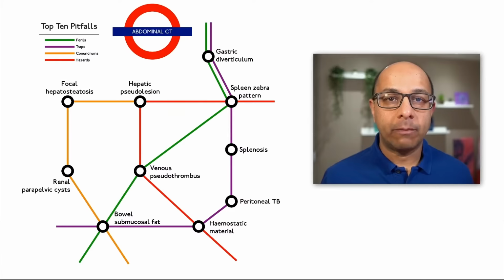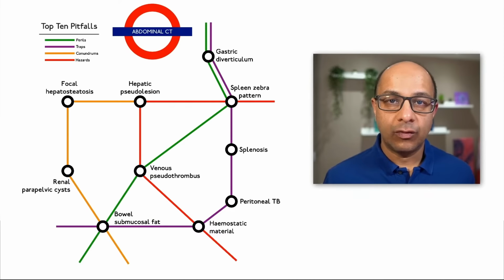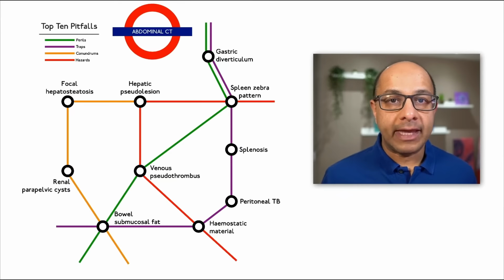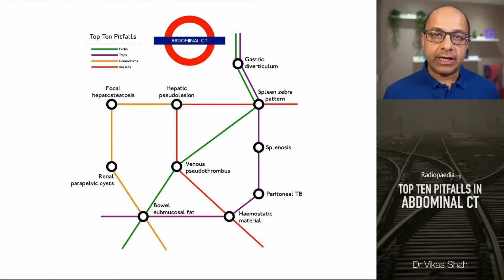I've picked out my top 10 stations to visit, where we will examine the pitfalls that await the unwary. By the end of this journey, you'll be equipped to navigate all of these danger zones by yourself. We'll begin our journey at gastric diverticula.